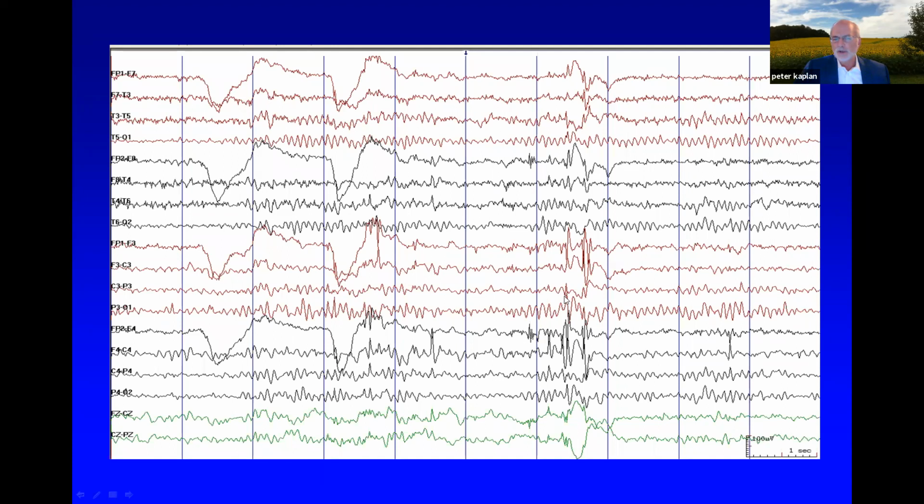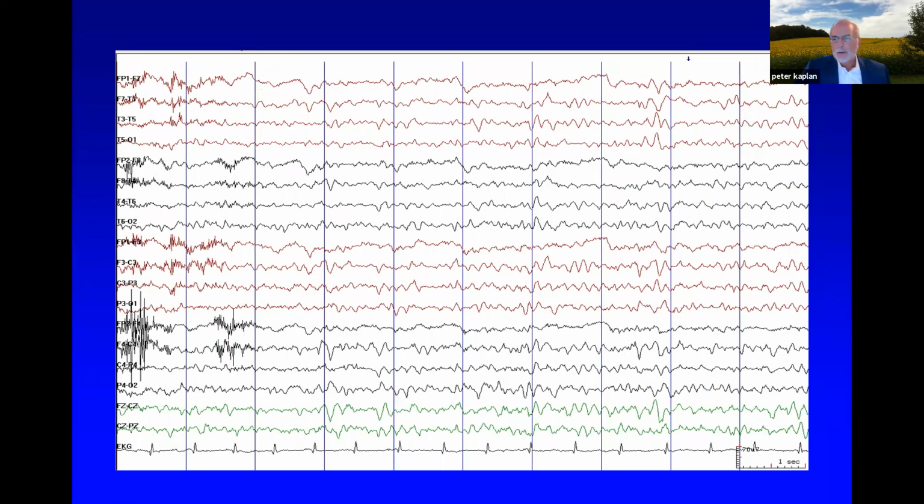So let me show you this. Here you can see in the second here, an eye blink artifact. And after that, the appearance of the alpha rhythm, 4 on the left, 4 on the right, going front to back, posterior basic rhythm. The alpha is reactive to eye opening and closure. And therefore, this is a predominantly symmetric, normal, reactive alpha, and that has a good prognosis.